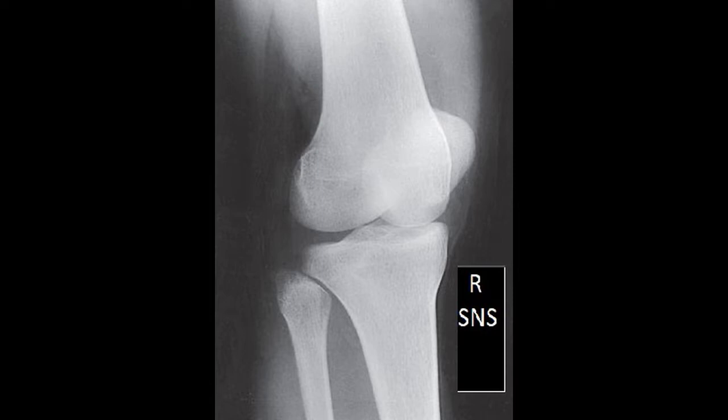You can see some of the posterior tibia there in that joint space of the femur and tibia, and you can see the lateral condyles of the femur and tibia very well, and both plateaus, and you can see that the patella is slightly beyond the surface of the femur there on the medial condyle.